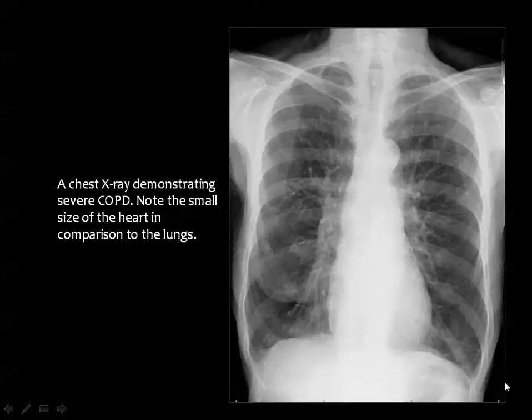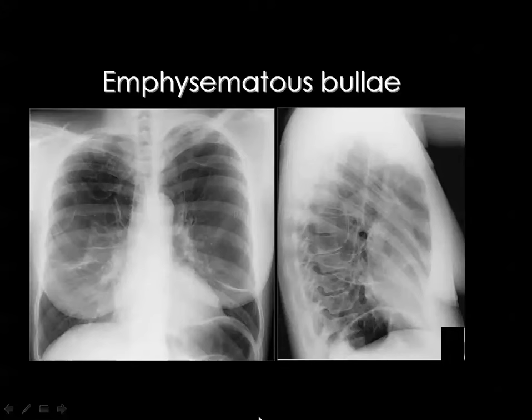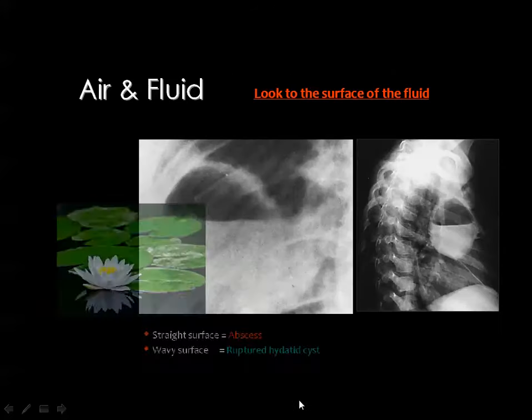of the right lung. And this is what we call chronic obstructive pulmonary airway disease, with hyperinflated chest, low flat diaphragm, ribbon-shaped heart, enlargement of the hilar shadows, and peripheral attenuation of the vascular markings, and I will discuss this in full detail in the topic of diffuse lung disease. Then this chronic obstructive airway disease may be associated with emphysematous bullae or not. And you see here gross multiple emphysematous bullae in both lung fields, both in the lateral and the frontal view.